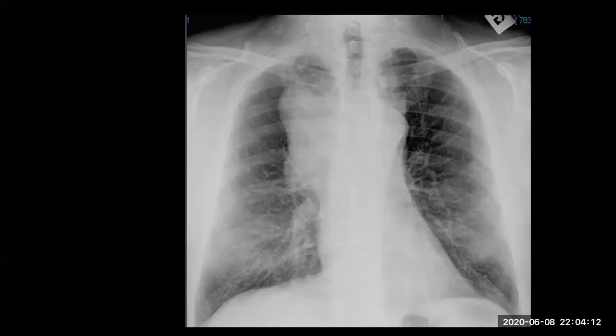Chest X-ray PA view of mature skeleton showing right upper zone homogeneous opacity with S-shape border, clear both cardiophrenic and costophrenic angles, no soft tissue mass or bone lesion. I suggest right upper lobe, right mid upper lobe collapse.